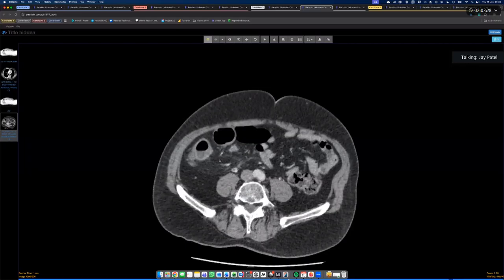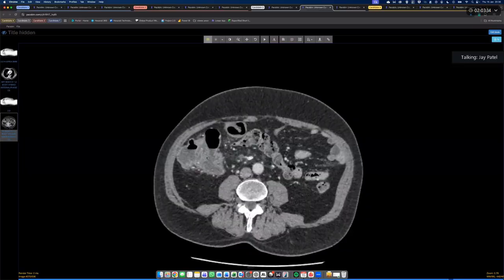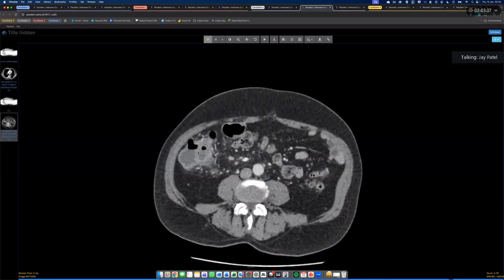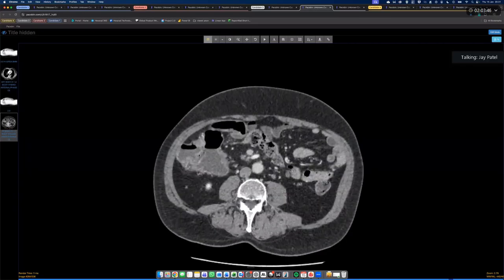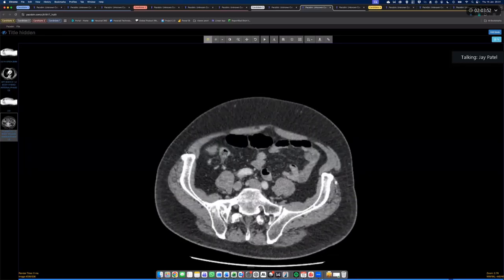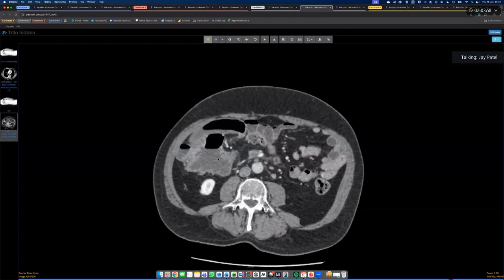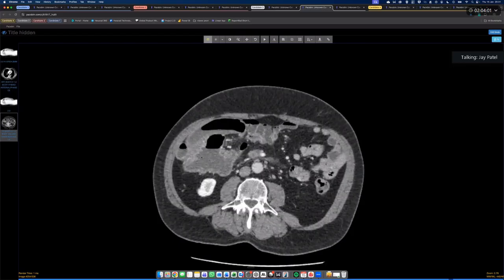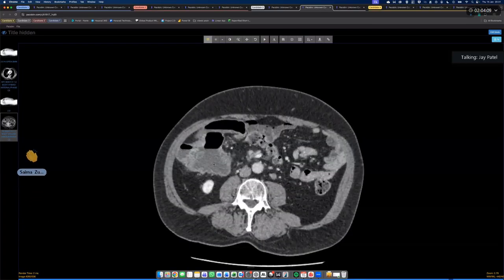So let's look at the bowel. Here there is the ileocecal valve. That bit, do you see that? That's the ileocecal valve. You go one way, you get to cecum. You go the other way, you get to ascending colon. This patient's bowel is a little bit malrotated. So in this case, this is the ileocecal valve, this bit here is cecum, and this bit here is ascending colon.